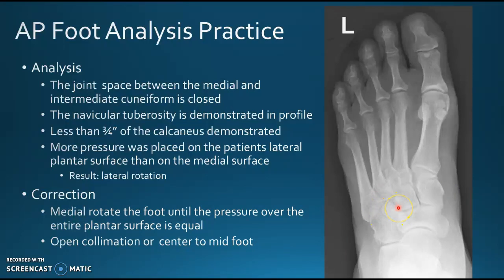The navicular tuberosity is demonstrated in profile. We see that here. Less than 3/4 of an inch of the calcaneus is demonstrated. We do not see that. More pressure was placed on the patient's lateral plantar surface than on the medial. This resulted in a lateral rotation.